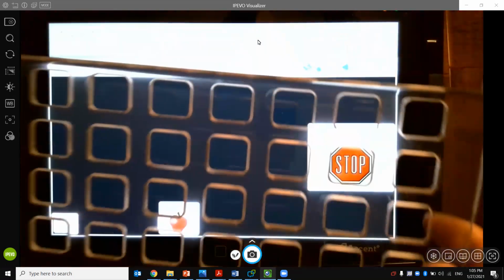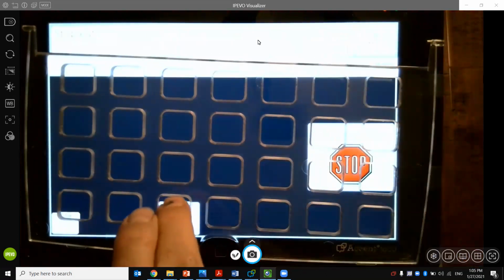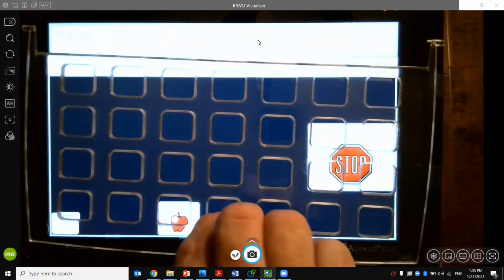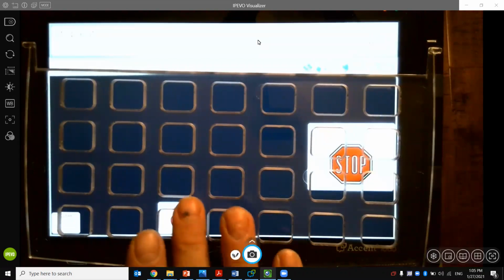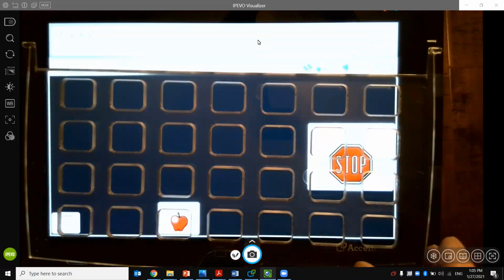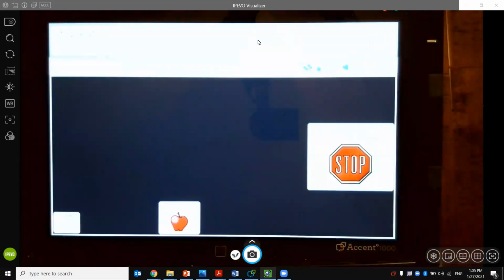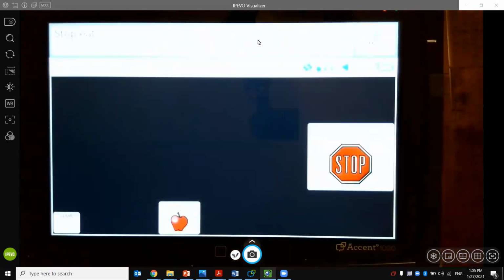I want to tell you something about using this one, the actual 28 key guard. You see how it would actually potentially block. You could still use this one, because it would fit on there pretty nicely now. See how that fits right on that spot? This extra grid area would give you an extra area to secure their hand to go in. But just as soon as possible, get back to that 84 grid, because you're shaping this motor plan. You're not trying to change it.